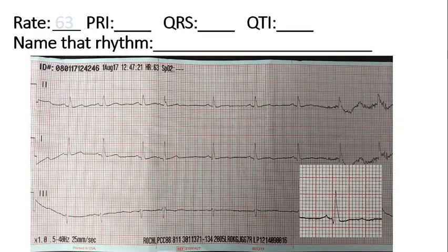and you see this. So let's go back to, is this sinus? Is there a P wave? Is a P wave round, upright, and 1-to-1 with each QRS? And it looks like it is. The P waves might be a little bit peaked, but I don't think that's overly concerning. If you look down the lower right, you can measure out the QRS if you'd like.